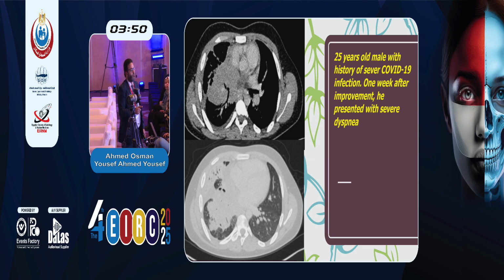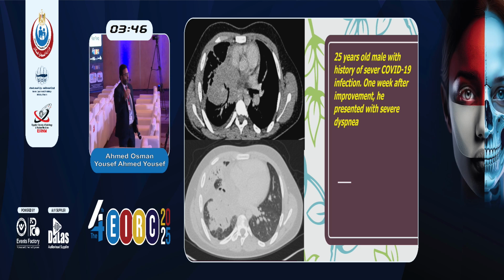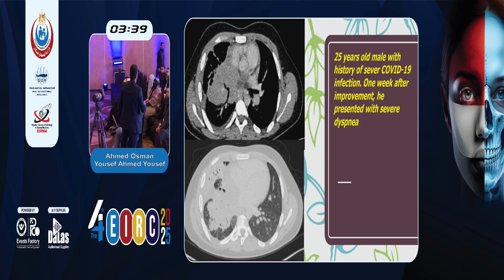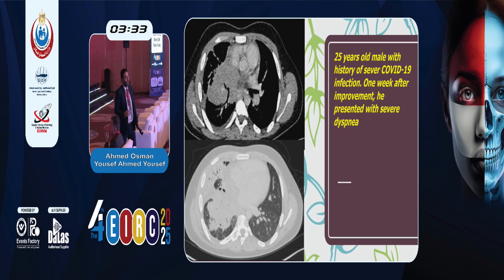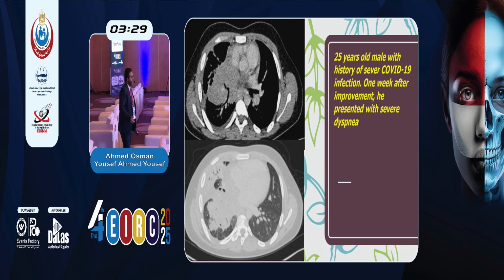This is an important factor in your reports. Regarding age 25, we can put bronchogenic carcinoma as a remote possibility, and lymphoma of lesser extent, of course with the history.